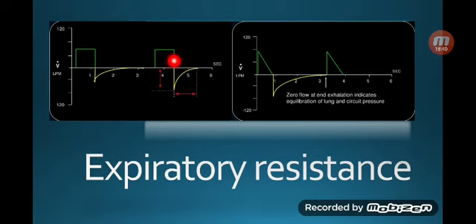While here, although the pressure was high, you managed only to get this amount out, and the rest had to take all of that time to go out. So the resistance is high in this case, which means this here represents an obstructive lung disease, like asthma, like bronchiolitis, like COPD in adults, where the resistance is so high against exhaling.